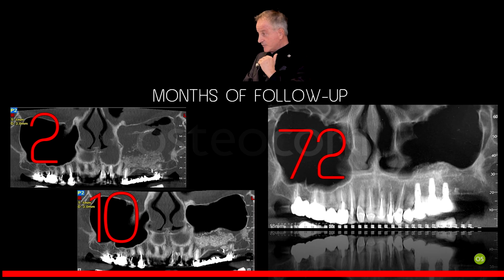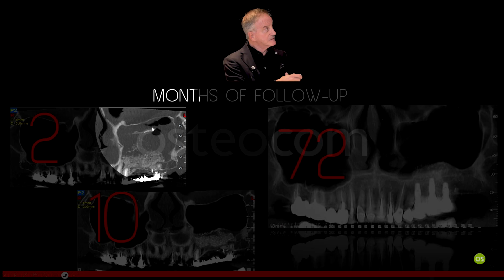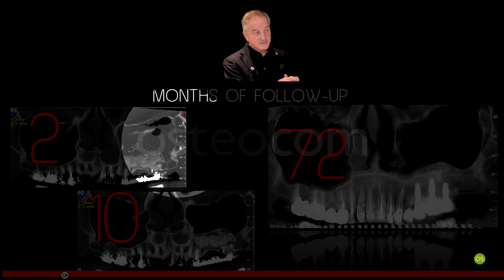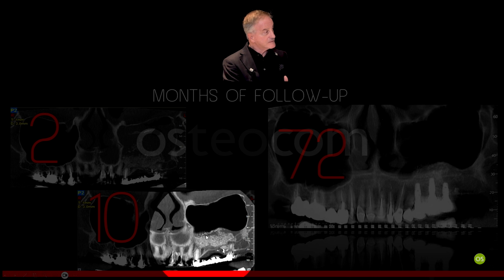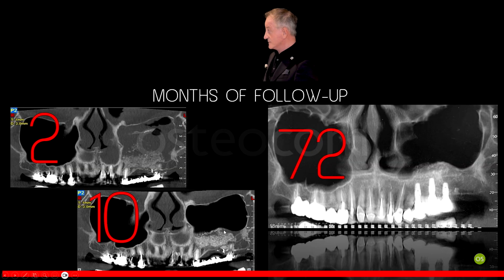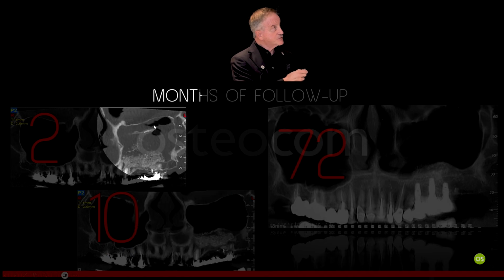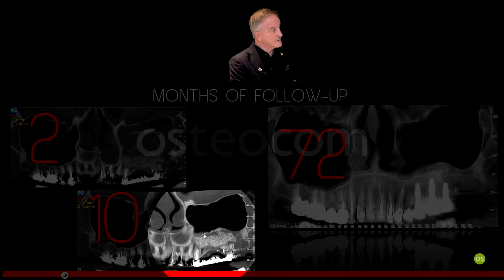Now, upon resolution, we can understand that this one was not grafted inside the sinus, this one was grafted inside an inflamed membrane. Because you see that the shape and the morphology of this graft material is the morphology of this graft material.